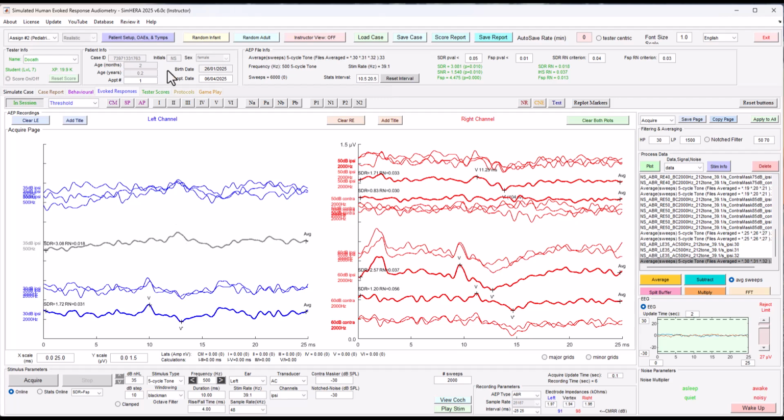Keep in mind that this is for 500 hertz, so your template in your brain, your matching, is not going to look like a 1000 or 2000 hertz response, which you see down here. It is more drawn out and a little bit more delayed, but that's a definite response being present for 500 hertz. Some early clinicians or new students might find it challenging to see those responses, but the more you practice it, you will end up realizing that those are responses being present there.